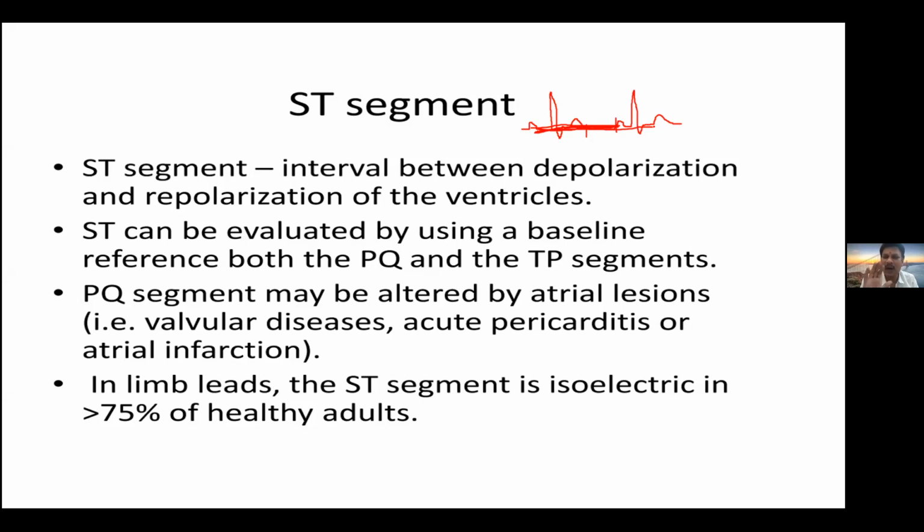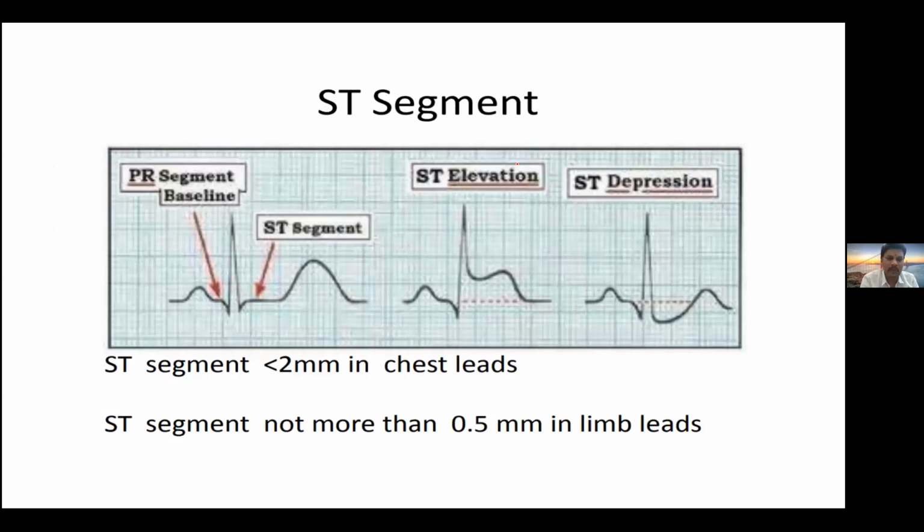Now we know, how do you calculate the ST segment? What is the ST segment? Between the depolarization and repolarization of the ventricle is the ST segment. This is very, very important in your diagnosis of chest pain. How do you calculate the baseline? Baseline is calculated from the TP segment or the PQ segment, right? So now I will come to this. See here in this picture.